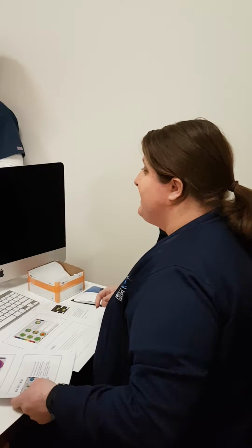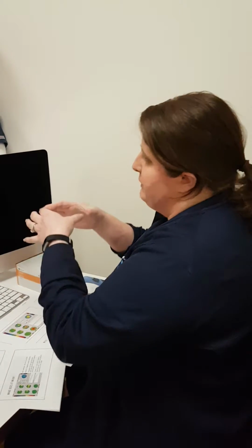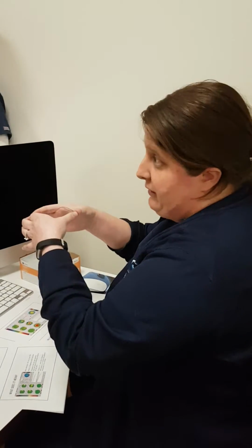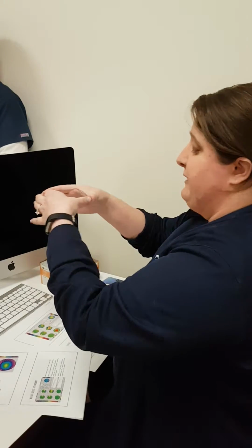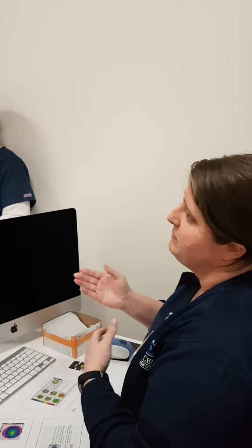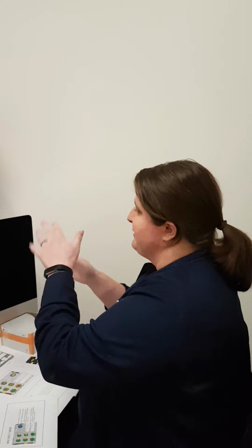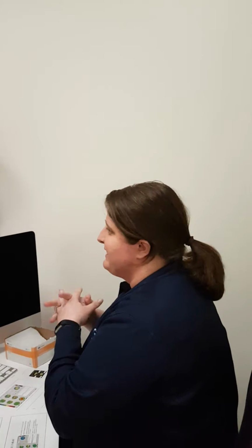Displaced areas of thinning. If you saw that, the warmest areas should be right in the pupil area of the map. If it's off center from that, that's very worrisome for some sort of ectatic disorder, just because that's where the thinning is happening off center, which can be irregular astigmatism, right? If you're looking through different curvatures, that's not going to help your vision.